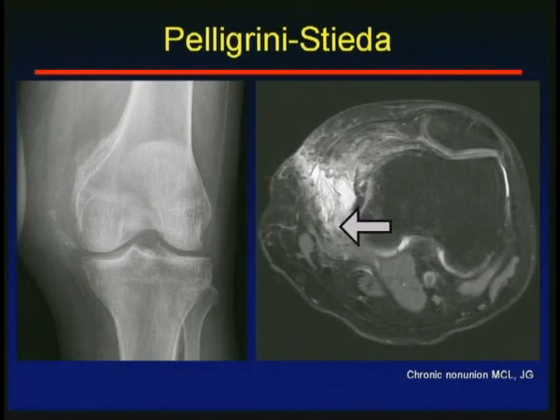And you can see this large fluid collection as she's leaking through the medial collateral ligament and its retinacular junction, lots of ossification and a big soft tissue mass, and then she required very extensive surgical reconstruction with a graft jacket for this chronic non-united medial collateral ligament, but an uncommon complication of MCL.